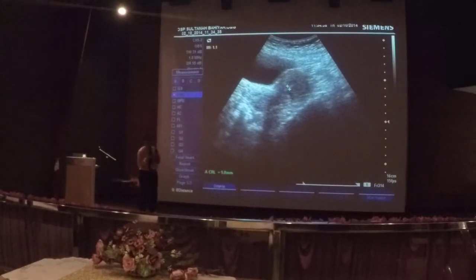So if you look at this, what is the first thing you notice when you look at the sonographic picture? What is it? Any answer? I took this one, can I use it? Play it. Can use it from far. What do we notice when we look at that? Normal or not normal? Normal, but upside down. That's the first thing.